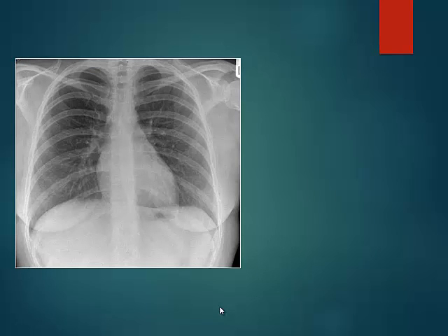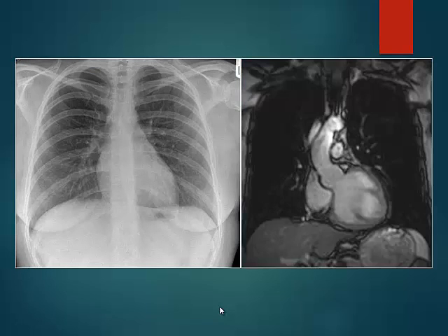And this is showing the same thing. This is an MRI image which shows the SVC, ascending aorta bulge here, the right atrium, left ventricle with apex. This is the pulmonary artery. This is the left atrial appendage and the aortic knuckle.